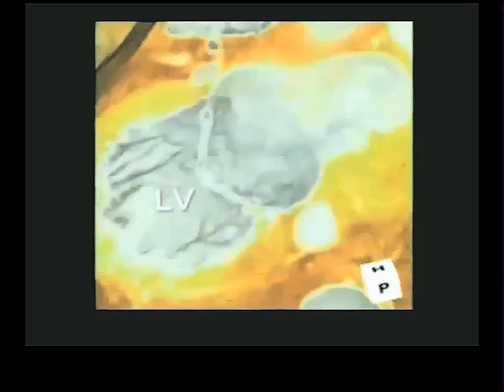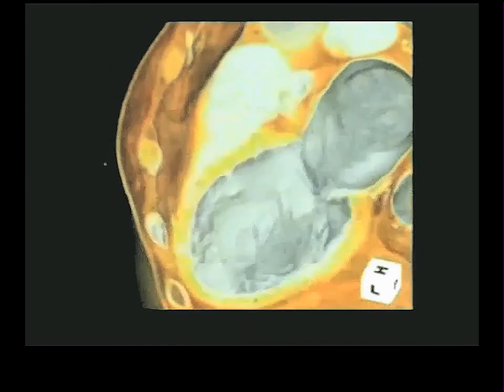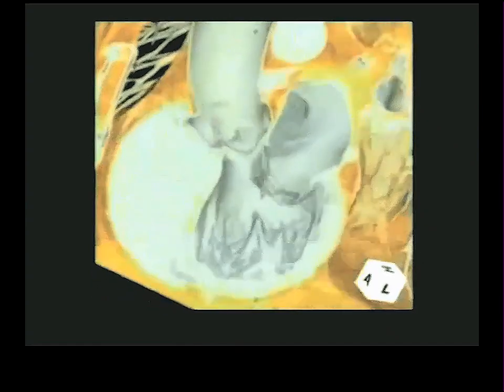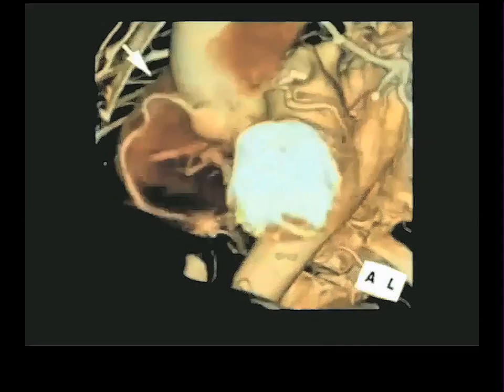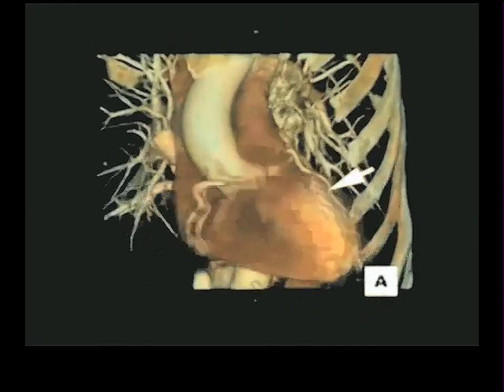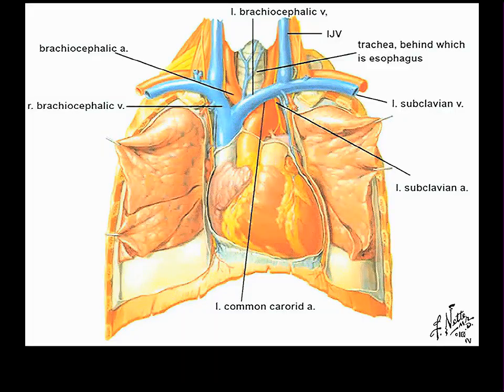The left ventricle, again, is coming into view. This is the left atrium, separated by the mitral valve. We see the chamber contracting here, a bit weakly. The blood is then entering the left ventricle, being pumped out through the aorta. And again, we see the right coronary and the left anterior descending and circumflex coronary arteries. The heart, of course, is covered by the rib cage. So one has to see that because it's just too cool to understand what you can do nowadays with just CT angiography and the computer volume rendering of it.